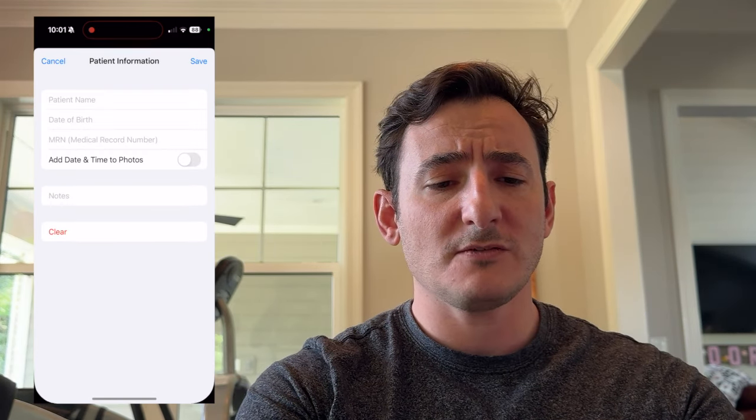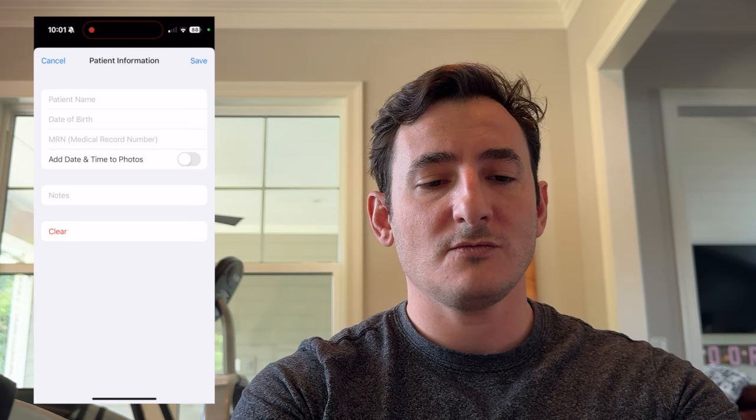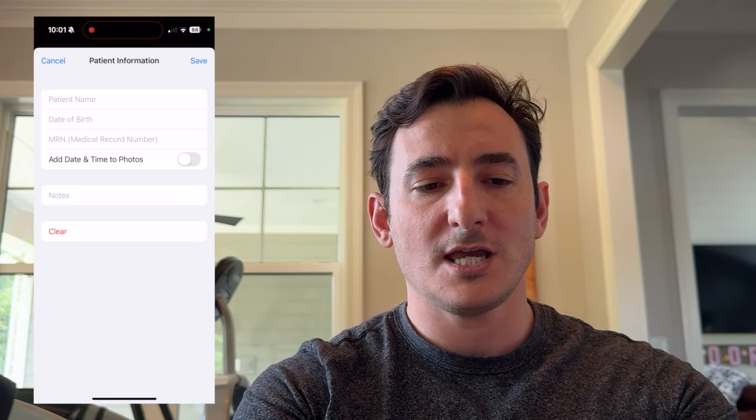If you tap patient info, again, you can put in some patient info and it will record this on any photos you take. On the bottom here, you'll see there's a focus lock. If you tap the focus lock, the slider will allow you to manually control the focus, which can be helpful when trying to get the retina in focus. If it's unlocked, the autofocus will work. And then you have an exposure slider and you have a torch slider. So that torch slider allows you to control the brightness of the torch. It's kind of like a digital rheostat.